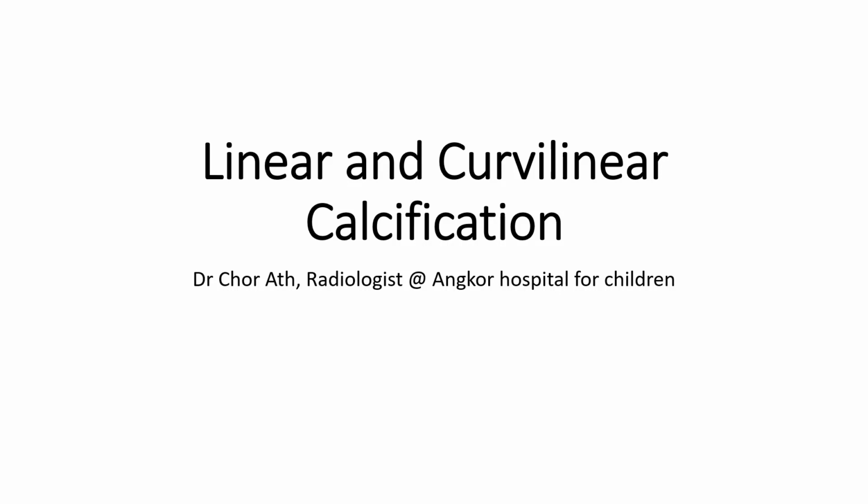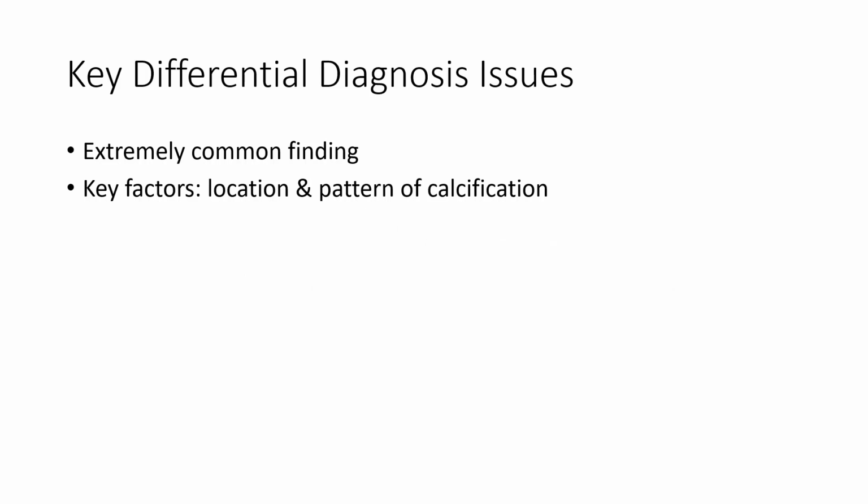Hello everyone, today I'm going to show you about linear and curvilinear calcification in differential diagnosis. The key differential diagnosis issue is that this is an extremely common finding. The key factor is the location and pattern of calcification.